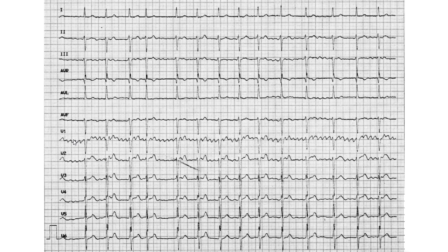No, what? How did they? Okay, that's very strange. I'm not sure how they got their answer, but they somehow used the wave as the FF distance, which is about 3.5. So sure, allow them, but basically again and again, if you're able to present your logic, then no one's going to have a problem with you.